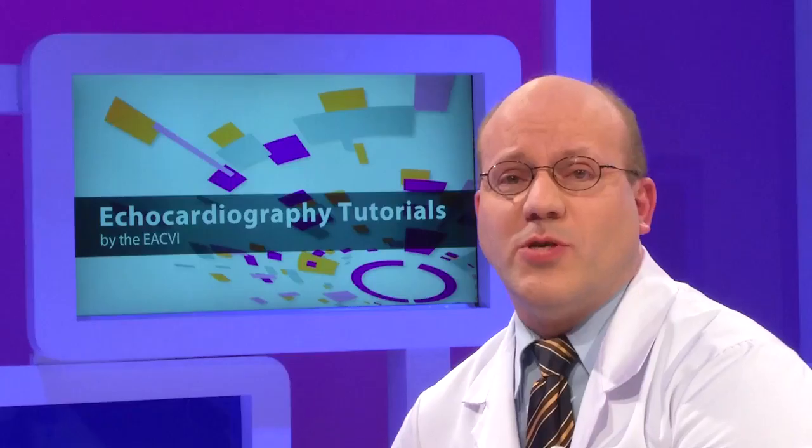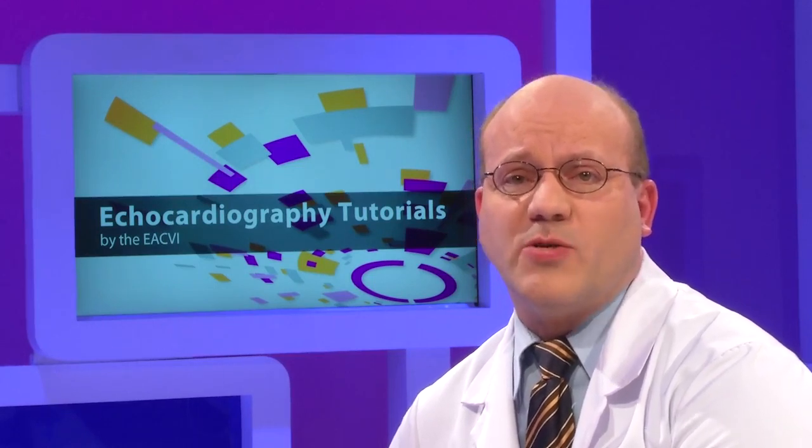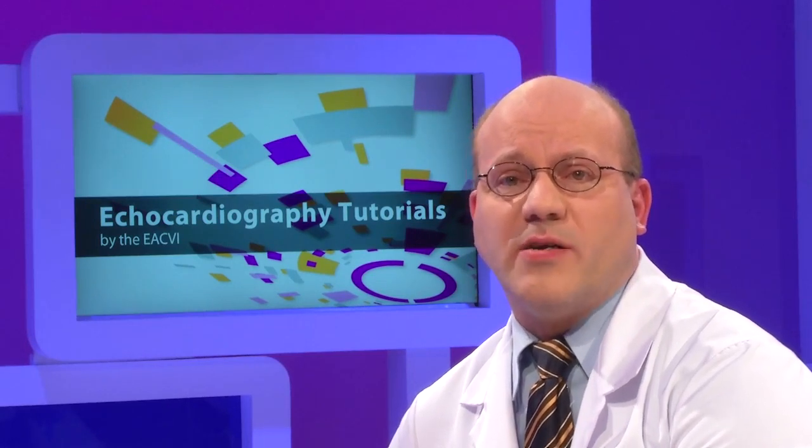So I hope I could show you how you can use tissue Doppler and speckle tracking for quantifying regional and global myocardial function. So the key messages of this examination is that first we have to optimize the images, quality, to optimize the settings for the different modalities, but also to record several loops, and finally to take into account that we have to look at the valve in order to have a good timing for an appropriate analysis of the data.